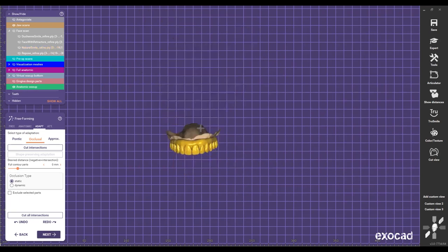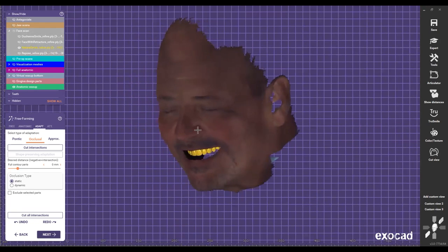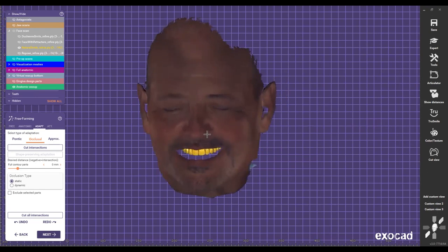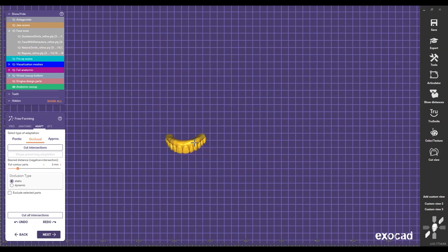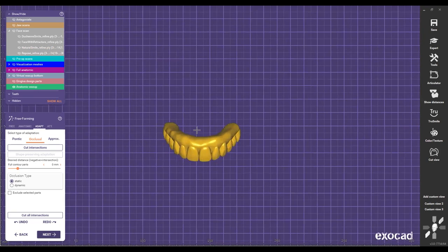That's how confident you become once you start understanding how to make these cases with the face in place. I started doing this in 2015, and since then my career changed. Plus, Exocad changed my career, so I'm very happy because of that. Plus facial scanners, and not every facial scanner works the same. As you saw at the beginning, we're able to match the intraoral data with our facial scanner accurately.